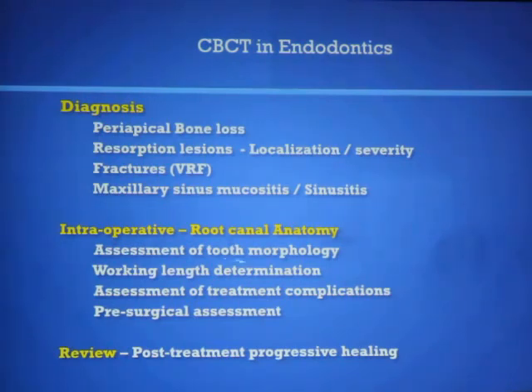The other intraoperative use is assessment of the tooth morphology, so we don't miss the canals. We check the working length and check for complications. We didn't see in detail the pre-surgical assessment, but for apicoectomies we can see the exact dimensions of the lesion and the proximity to vital structures like the inferior alveolar nerve or maxillary sinus, and it really prepares us before we actually put an incision in the gums.